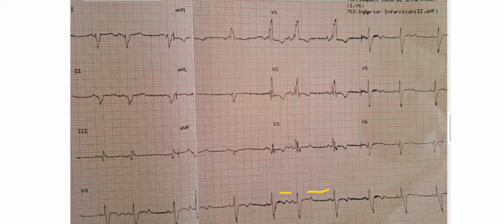And this one is also very short. These ones look almost the same as this one, but this one has got a size of its own, so it's irregular. That's the bottom line.